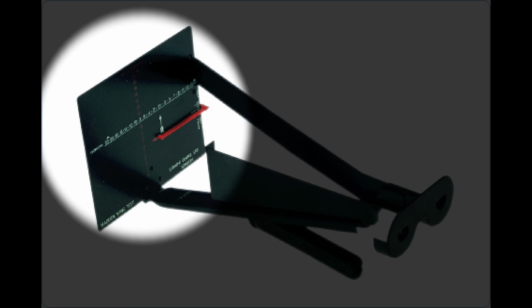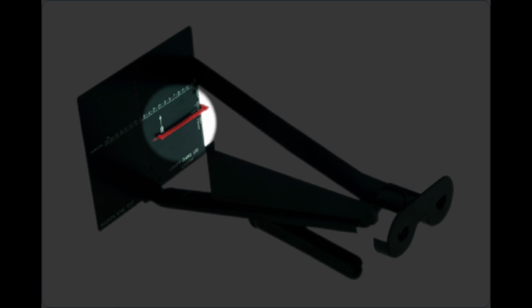The measuring board. Used to measure the deviation of the heterophoria and also torsion. The measuring board has the horizontal, vertical, and torsional scales. The board also contains the red and white arrows. This will be further discussed throughout the video. The torsion lever. On the measuring board, there's an adjustable lever which the patient attempts to straighten to measure for torsion. The eyepiece lens holder. Mainly used to hold the lens for patients who have difficulty seeing the board with their glasses.